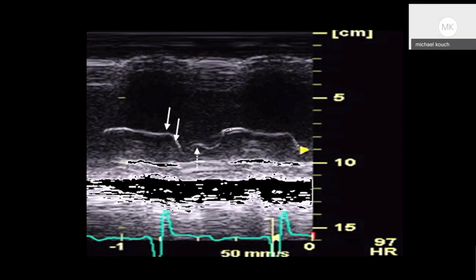Here's a more real-time picture of an M mode, kind of what it more often looks like, is we see no A wave here, right? So the atrial contraction isn't really large enough to affect the right ventricular chamber so much because the RV chamber is probably so big and dilated and hypertrophic already, right? And so there's no effect of that atrial kick on the leaflet itself. And then in the mid aspect of systole, we start to see bowing backwards of the pulmonic valve.